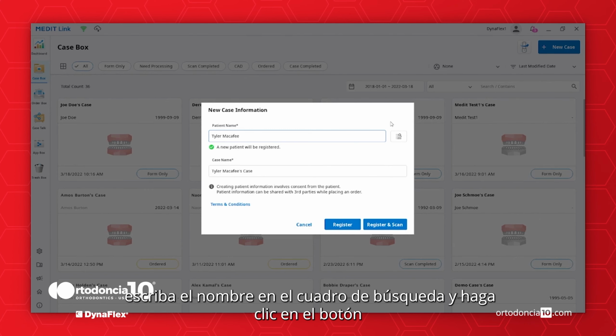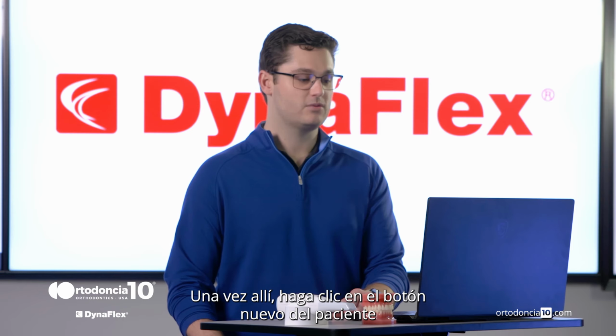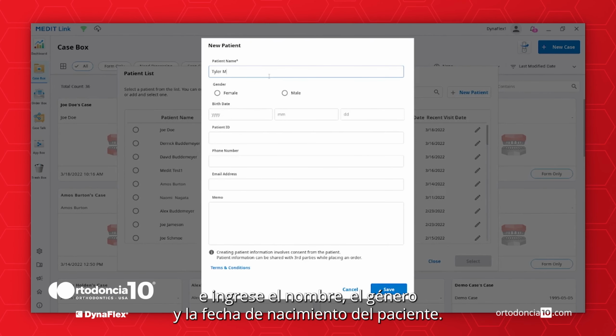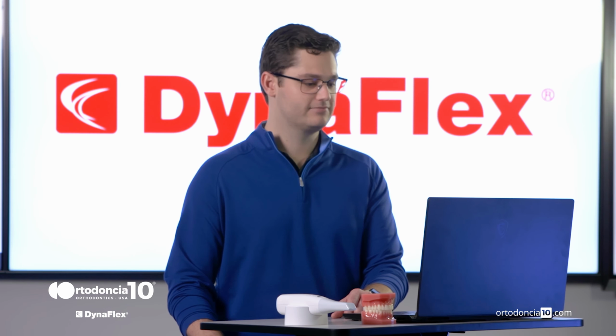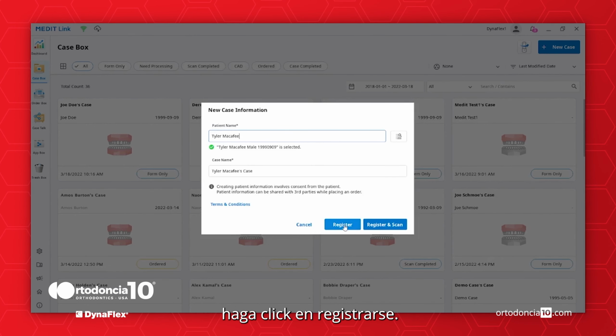Type in the name in the search box and click the Directory button on the right side of that search bar. Once there, click the New Patient button and enter the patient's name, gender, and birth date. These are the only 3 fields that are required, but if you'd like to enter more information, you're more than welcome to. If you're prepping for patients who are not currently in the chair, click Register.